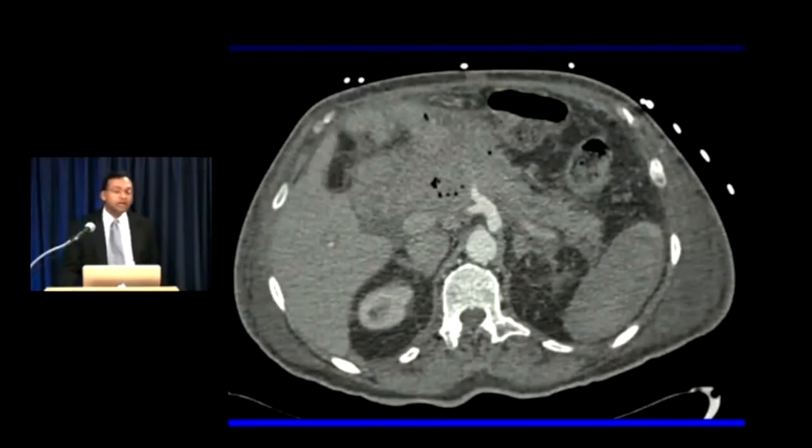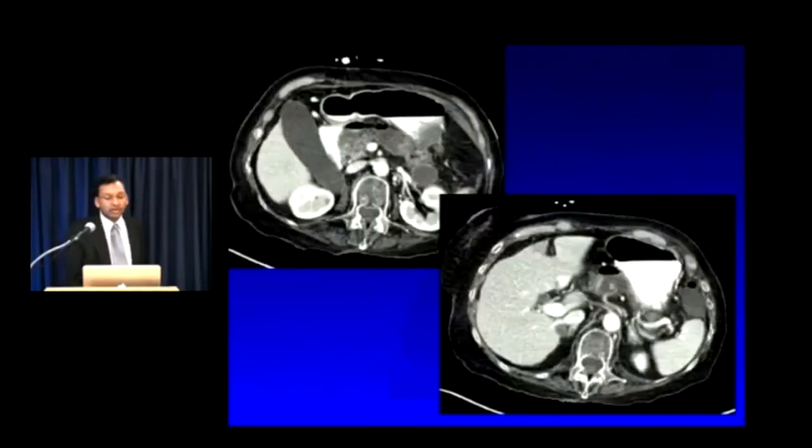So here's an example. This patient has necrotizing pancreatitis. You don't see much of the pancreatic head, neck, and body. There's actually hemorrhagic transformation. But this patient has never been biopsied, never intervened upon. There is ectopic gas in the pancreatic bed. This is infected necrosis. And the patient went on to get a necrosectomy. Here's an even worse case. Not much of the pancreas left. There's actually a big air fluid level where you'd expect the pancreas to be. Classic infected necrosis. And again, this is a patient who went on to the operating room to get debrided.